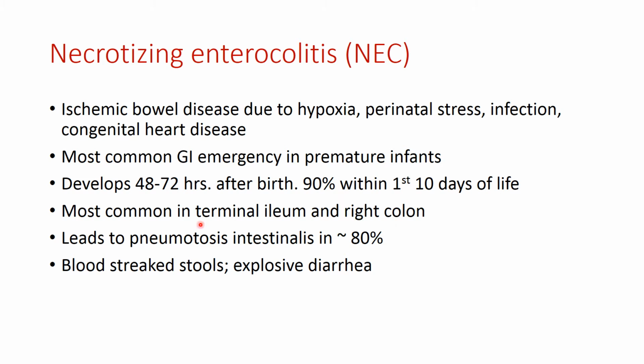80% of these kids have pneumatosis intestinalis, and I'll show you pneumatosis intestinalis. This is the physical finding that we see on X-ray and CT scan. In fact, it's so common that amongst radiologists, we will often use pneumatosis intestinalis and necrotizing enterocolitis interchangeably. Okay, that's not technically correct. Necrotizing enterocolitis is the underlying pathology that leads to breakdown of the wall and air leaking into the wall of the intestine, or pneumatosis intestinalis.